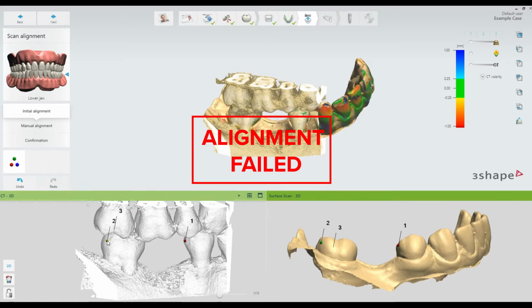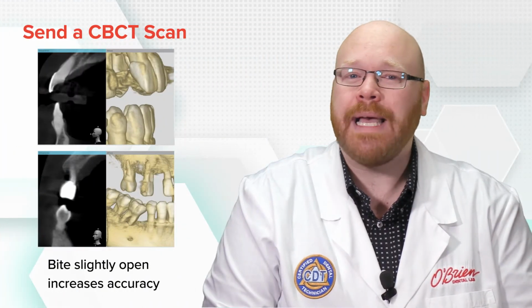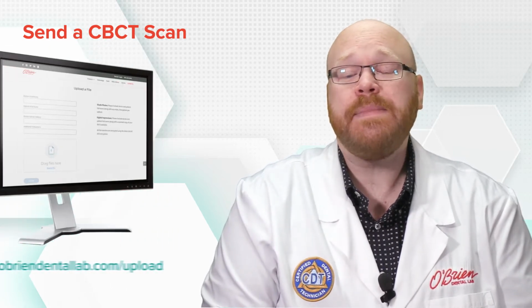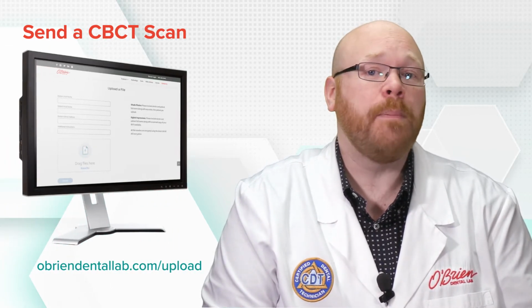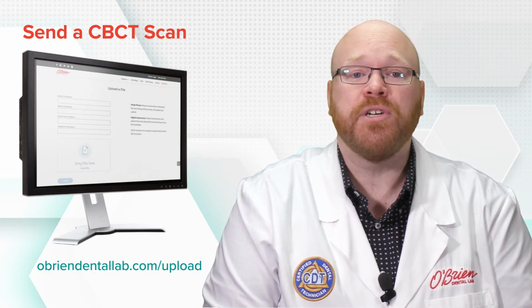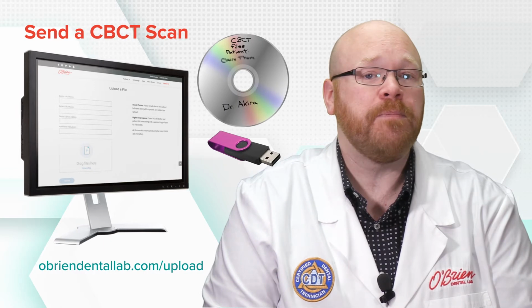When taking the CBCT, we also recommend that the bite is slightly open as it can increase the accuracy of the guide. The CBCT files can be sent to us through our upload portal at the link provided on this page, or you can send them on physical storage such as flash drive or DVD.